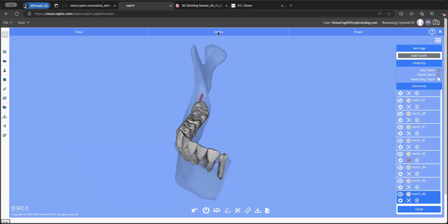Another interesting feature. Well, before the interesting feature, I just want to reiterate that you can download all these images, or really all these STLs, as a zip file, which you can then either import into other software, or just view with a local viewer, like Meshmixer and Blender, and all kinds of viewers that allow you to manipulate and play around with STL.